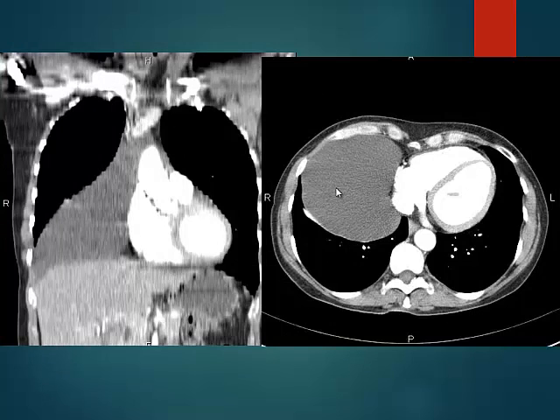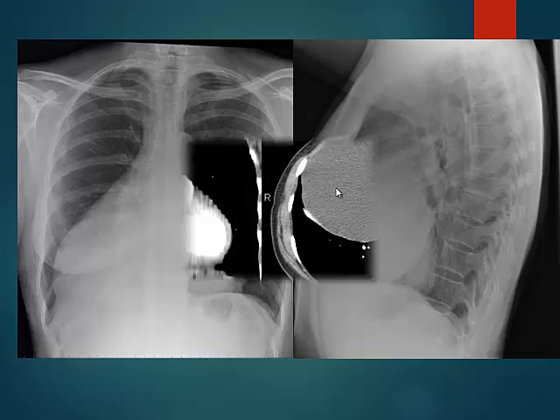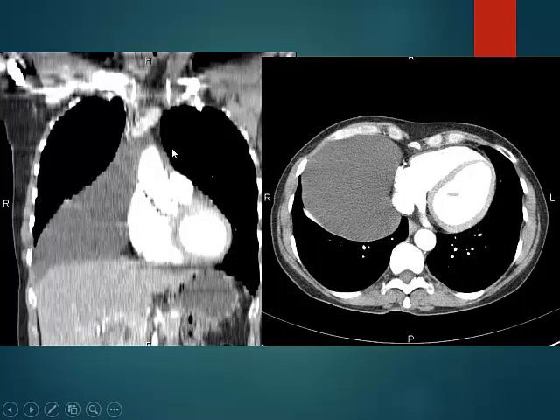Okay, so what is this? It's a pericardial cyst. Yeah, it's a large pericardial cyst, which was on the X-ray. If you go back to the X-ray, it looks almost like, you could say dextrocardia also, I think. Other differential of this would be a large thymic cyst, because it's going up to the mediastinum. You can see here, all the way up.